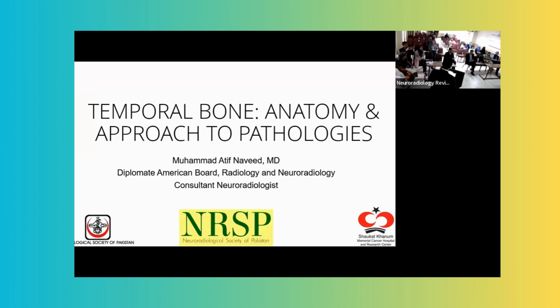So I will today talk about temporal bone anatomy because this is a challenge for young residents as well as junior consultants, and including me. And also I will not talk about the whole pathologies of the temporal bone because it's a vast subject. I will just talk about some cases, and I will show you how to approach these cases and how I approach them.